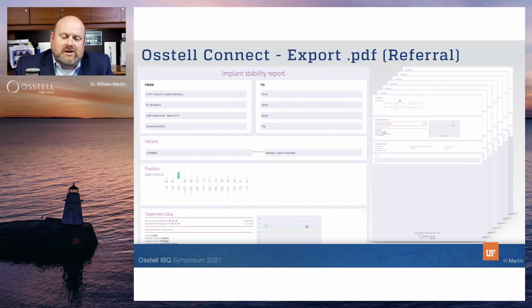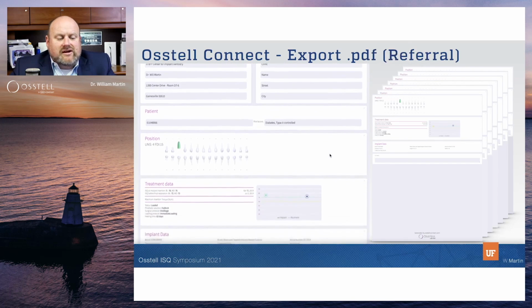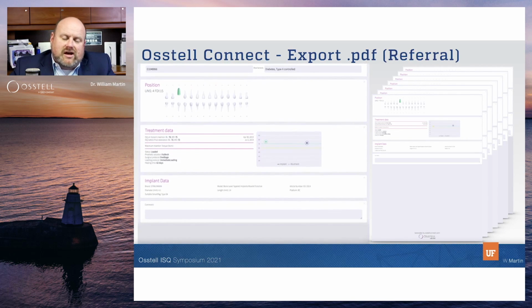That's why you see so many pages off to the right, because that's each implant there, and it captures not only the risk factors associated with it, but the Osstell measurements over time, the type of implant that was placed, and any comments that you may want to write in there.